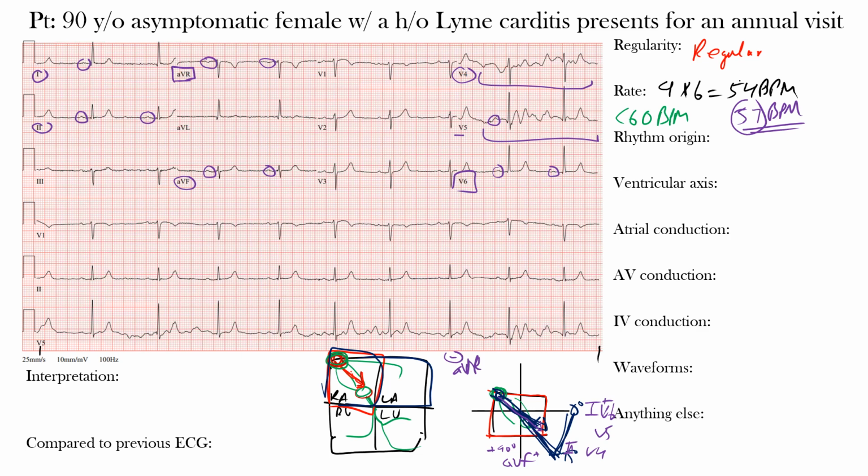have similar morphology, okay? So if you look here at lead 2 in the rhythm strip, you'll notice that all these P waves throughout have similar morphology, okay? And the other thing is that we want these P waves to be preceding every QRS complex, okay? And there should be a 1-to-1 ratio where you have one P wave for every QRS complex, okay? So here's one P wave, and then we have our QRS complex, P wave, QRS complex, P wave, okay? So we have a regular rhythm, one P wave for every QRS complex throughout, okay?